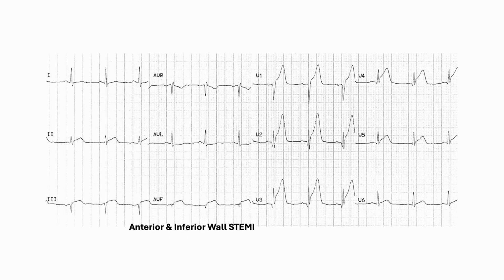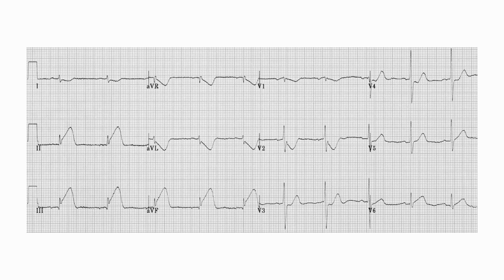So the diagnosis over here is anterior plus inferior wall STEMI and this patient needs to go to the cath lab. Okay. The next image is over here for you all to look at.